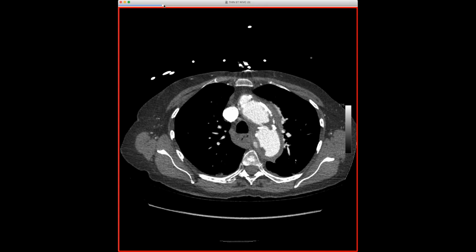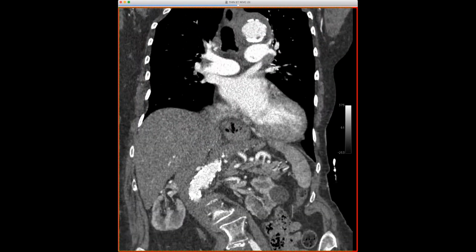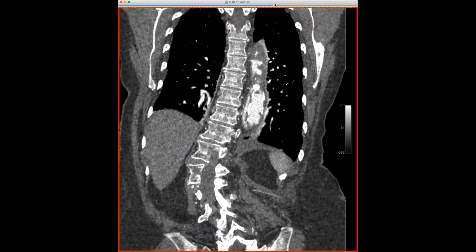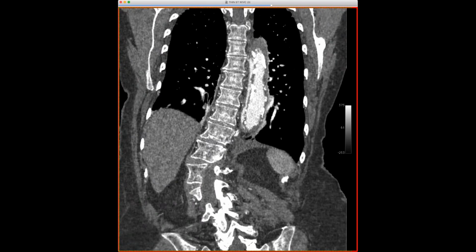That makes sense. Okay. I like the theory though, sometimes. It's not rare to have an acute aortic syndrome when you have features of more than one simultaneously. So sometimes these might be hard to separate according to the classic distinctions we try to make. This one's really interesting in that respect. Well, I think actually, it's quite interesting. You really have a pretty long continuous channel there.